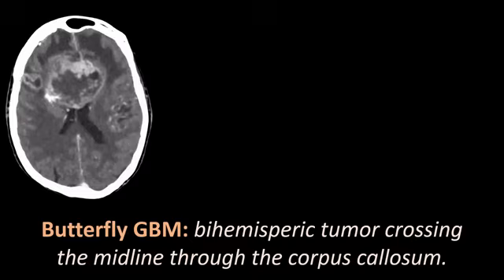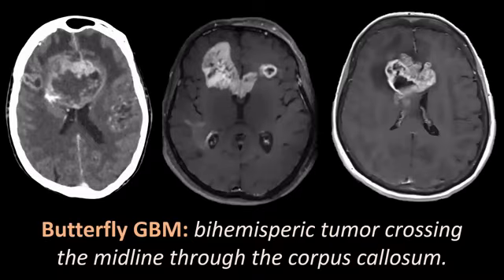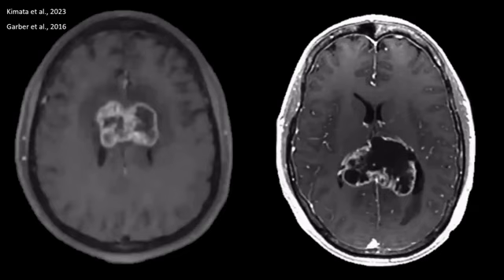Glioblastomas are the most malignant primary brain tumors in adults, and they preferentially arise in the deep white matter. And when they arise in the white matter of the corpus callosum, they can have this configuration and then spread in both cerebral hemispheres. And here we see some examples, and glioblastomas are typically centrally necrotic tumors, as you see on these images. The main differential diagnosis for a glioblastoma would be a metastasis, but metastases rarely arise centrally in the corpus callosum. Nothing is impossible in radiology, but this belongs to the world of case reports.